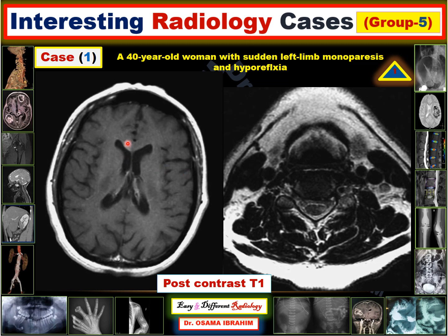So there are enhancing lesions in the white matter of the brain at that region, which is representing the genu of the corpus callosum, and this one is the left lateral aspect of the cervical cord. So let's get to the next slide to discuss the case.